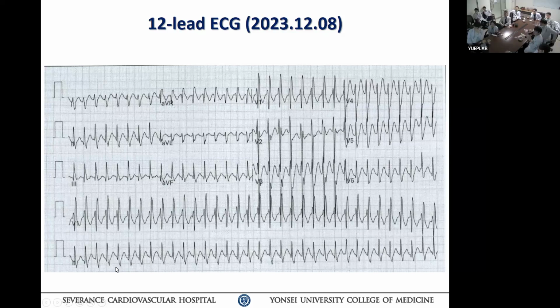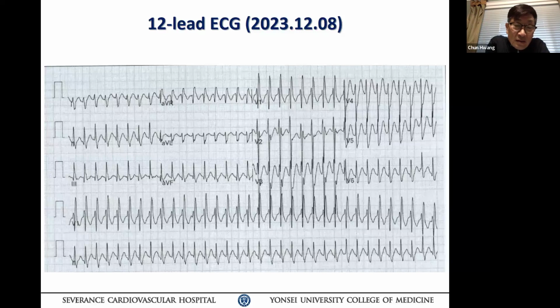There's also a slight hump at the beginning of the ST segment of the tenth beat. So there is some sort of non-consistent pattern that is altering our QRS complex from time to time. Right? So that could be ventricular tachycardia.